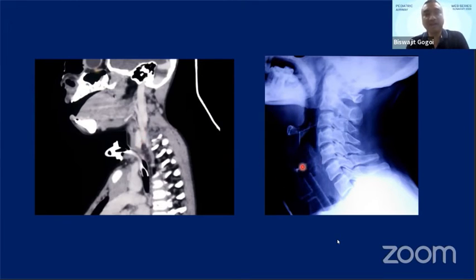And another X-ray I always like to quote. This is the X-ray I learned from Sanjay Sachdeva from Delhi. I asked him, how will you know radiologically that we can decannulate or remove the tube? He said to me, simply do an X-ray soft tissue neck lateral view and have a look if there is any air column between the soft tissue and the stent or Montgomery tube, and if it is free, then you can easily remove.